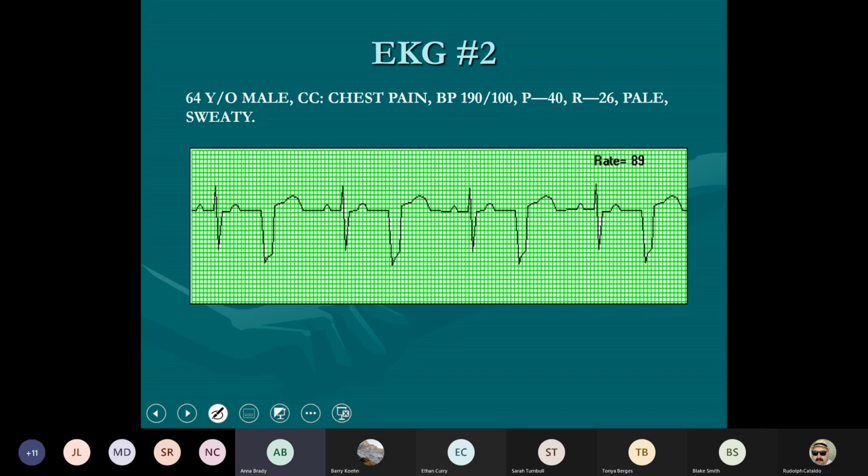I know tachycardia and bradycardia pretty well, but this one's got me confused. Okay, why has it got you confused? Because of the dip. Okay, so let's look at this. This QRS complex looks way different than this one, doesn't it? Right, yeah. Does anybody remember what I said? If you have a ventricular beat that fires early, what is it called? A PVC.